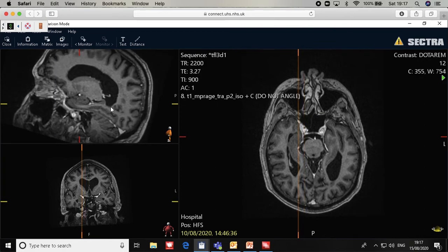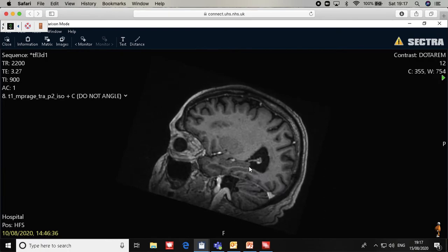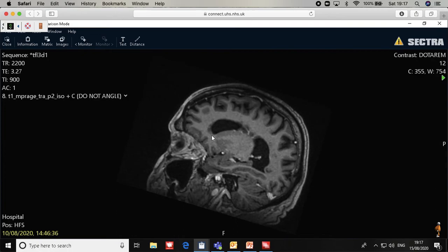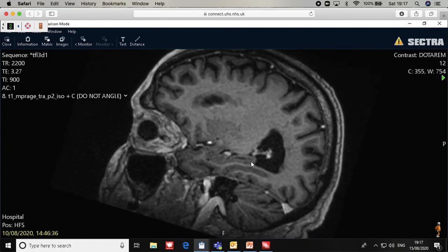I think this is very obvious here in the sagittal view. You can see it beautifully located. Just familiarize yourself with the lateral ventricle horn, and then just follow the gray matter. It's not difficult at all. The RTOG guidelines are also very clear. I don't have to spend more time. Though sometimes I still get confused with the amygdala tail, you have to familiarize yourself with this area as I'm doing now. We are all learning together, so this is where we are.